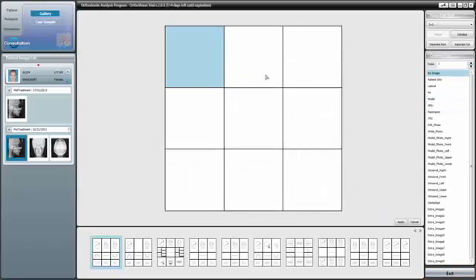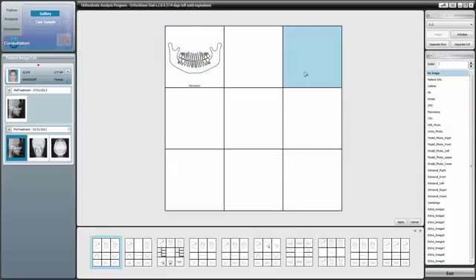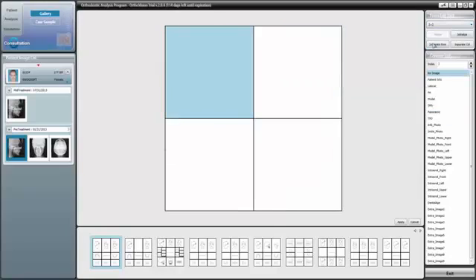We'll start by showing the Add function. When you click the Add function, you'll see a blank slate. To add an image, simply click a slot, and then select an image from the right menu. We can also select the type of table that's shown by selecting it in the Form Edit tool in the upper right. Please note that when you do this, it'll wipe out any progress you made previously.